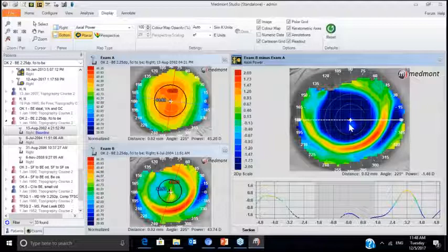So far, so good. The bad news is when we click our cursor in the center, we have only 1.5 diopters or 1.46 diopters effect, but out here we appear to have more effect, 2.5 diopters. If I click my cursor here, 246, over here, 231. So there's less effect in the center than there is in the periphery.